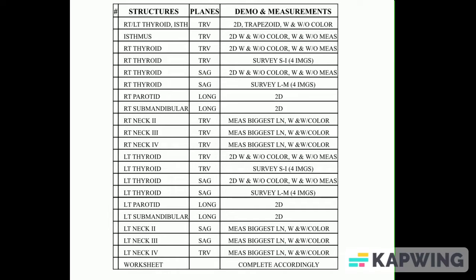Today we're going to be going through the thyroid ultrasound exam. I'm going to be talking about the protocol that we use at our institution, some pathology that we have images on, and the report that we would be using. And I'm also going to go into a little bit about TIRADS and how we would classify or put a point for any pathology that is seen.